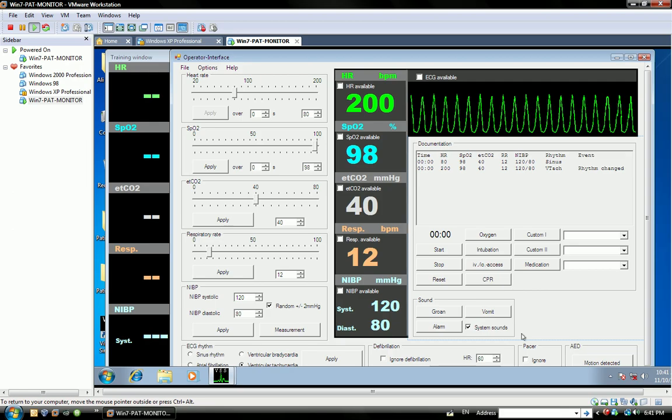And also the sounds are available for you to simulate, but keep in mind that these should not scare anyone if they hear these sounds. These sounds are just for representation of how critical a patient can be and how we can save the patient's life. These sounds are built for that purpose. Okay? That's very important to remember. Extremely important to remember.